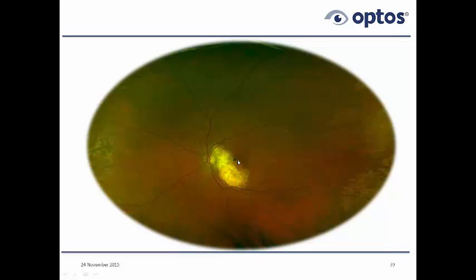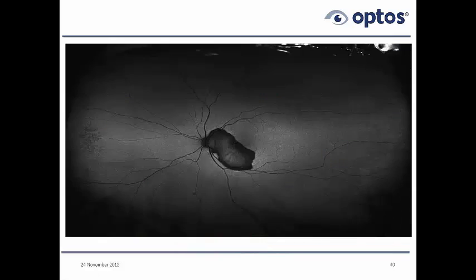So this is just prior to anti-VEGF injections being available, and he was able to laser this lesion, which was below the fovea, sort of between the disc and the fovea and a little bit inferior. But the fovea itself is actually uninvolved. The patient still has 20/25 visual acuity. With standard color, it looks like it's white. So we're actually looking down probably at the sclera. Most of the retina is gone, most of the retinal pigment epithelium is gone, and we're looking deeper into some of the choroid and actually down to the sclera.